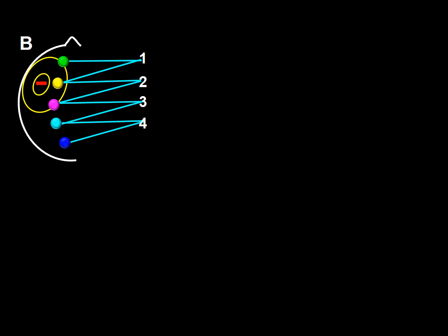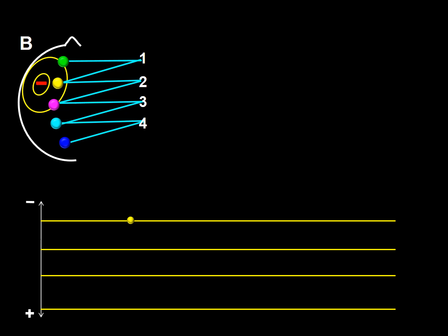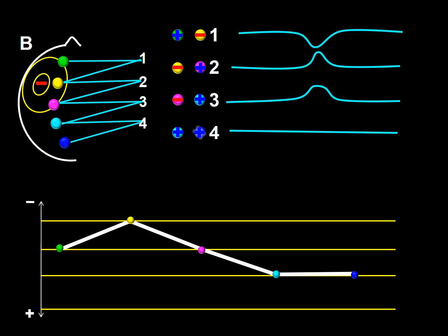We first look at the map and build a polarity graph, starting by placing the electrodes closest to the maximum of the field at its corresponding place in the chart and its corresponding polarity. Then going to the next electrode frontally, we place it in the appropriate electrode position and appropriate level. We then do the same we did in the prior discussion and go on to prepare the corresponding epoch by arranging each channel according to its input.